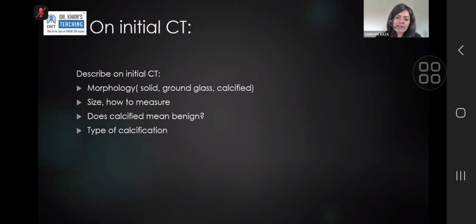When I say that, people automatically start measuring fat in lesions. So people start putting a region of interest on our PACS onto the lesion. And if you try tomorrow, go to work, pick up any lung nodule, any lung lesion, any lesion anywhere, and make the region of interest small enough and hover over it, you will find microscopic fat. You will find negative densities in any lung lesion. So don't stress too much on measuring fat. The fat that means benign pathology in a lung nodule is macroscopic fat. What macroscopic means is you need to be able to see it with your eye.